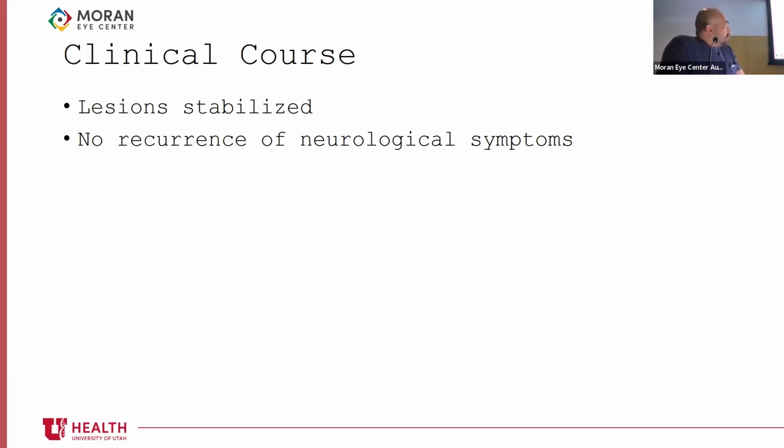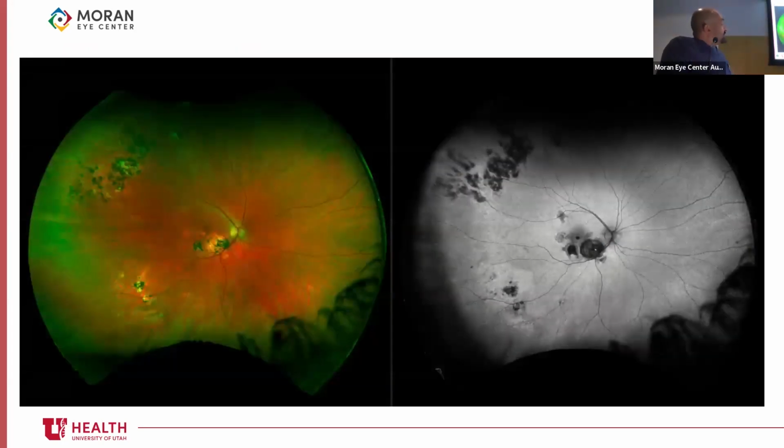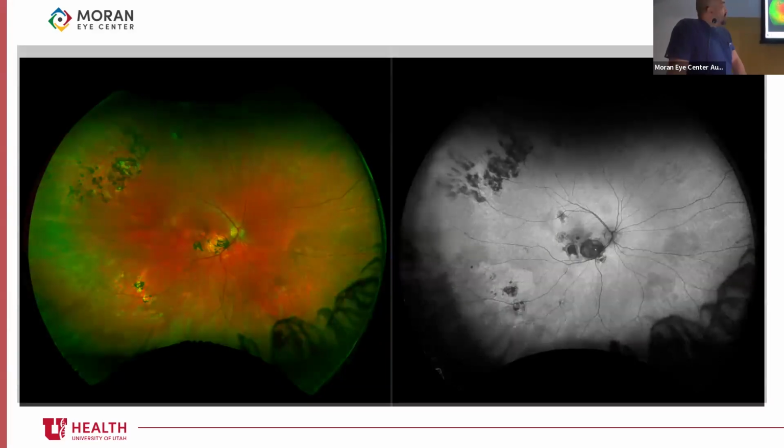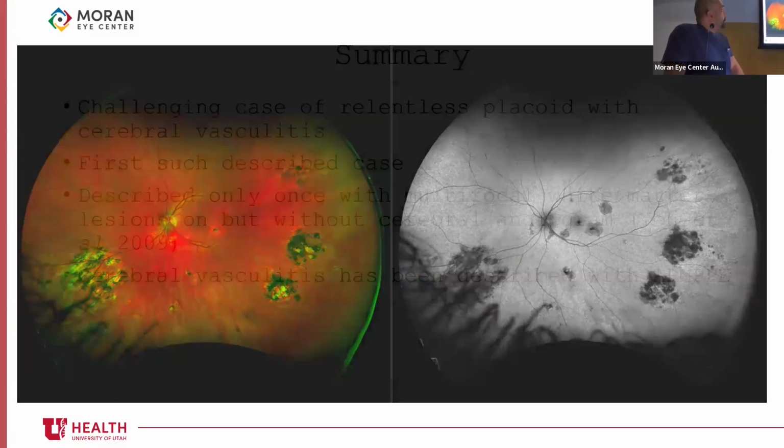She's now a qualified nurse. So these are the most recent pictures of her right eye. I saw her last week. She has stable atrophic lesions in her right macula that have not progressed for the last 4 years, and the left eye, just showing the extent of the disease, and how much more there is if you do autofluorescence imaging and if you look at the peripheral retina.